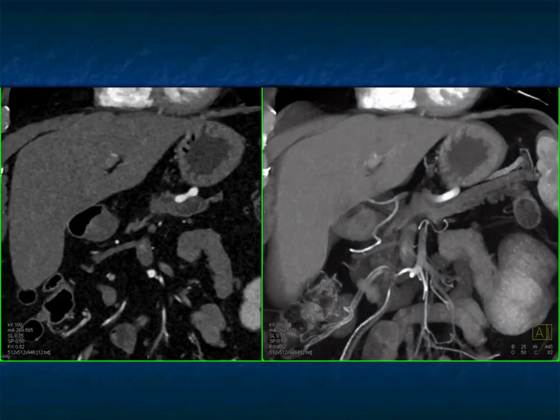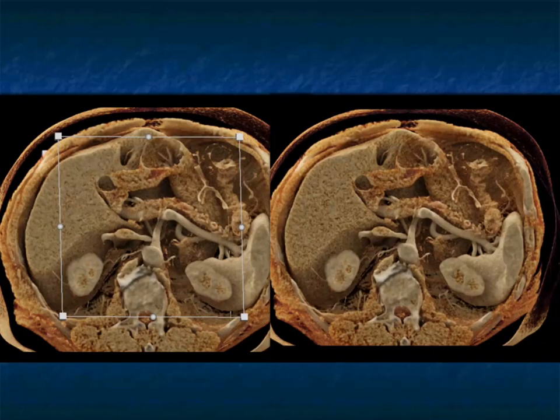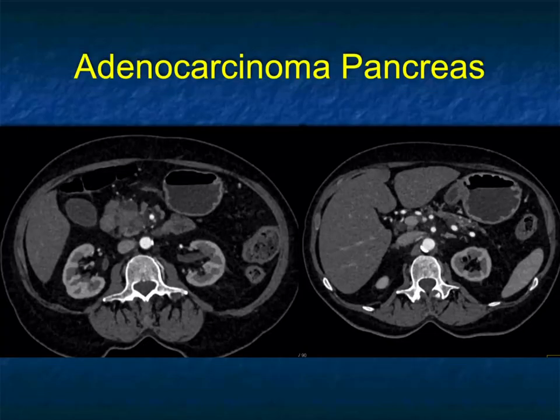And here's a few more views of that, showing you the arterial mapping as well. And here it is with cinematic rendering. We are using cinematic to look at textural change and pick up subtle lesions. I think textural change will be very, very important to us.